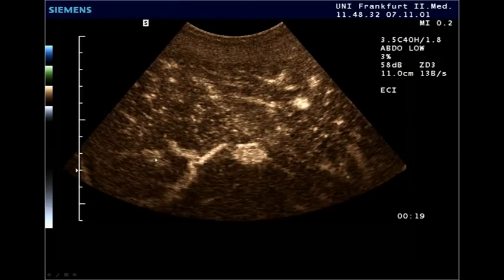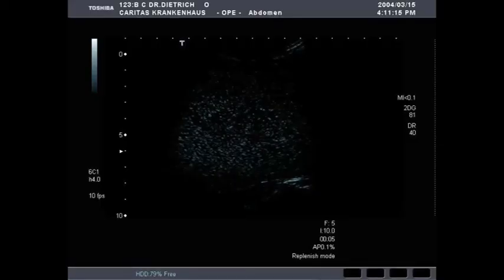After transplantation, you can see the lesion was much smaller beforehand. We have to learn that the size and growth pattern of hepatocellular adenoma might behave like malignant lesions. And malignant transformation is one of the big issues in hepatocellular adenoma. There's one exception. In former times, the telangiectatic inflammatory varieties have been summarized as focal nodular hyperplasia.